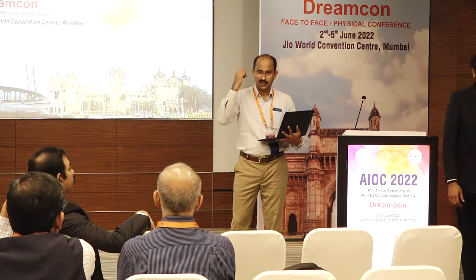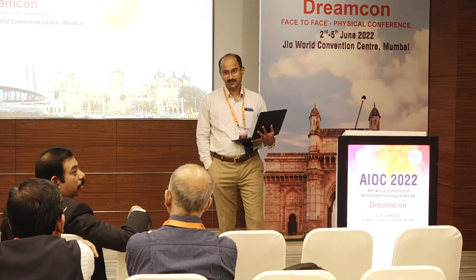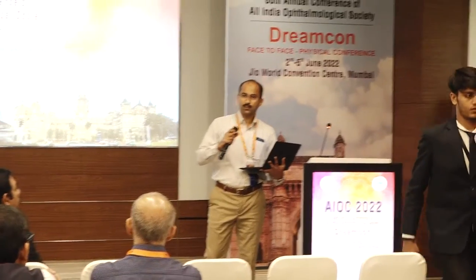So the moment I saw the consultant who referred it to me, I told this is optic atrophy. This is only the drusen that you are seeing, there is no nerve. And you can see the activity. And because of the OCT, it was an open and shut case. The moment you have a total ganglion cell atrophy, no RNFL, you know that it is obvious.